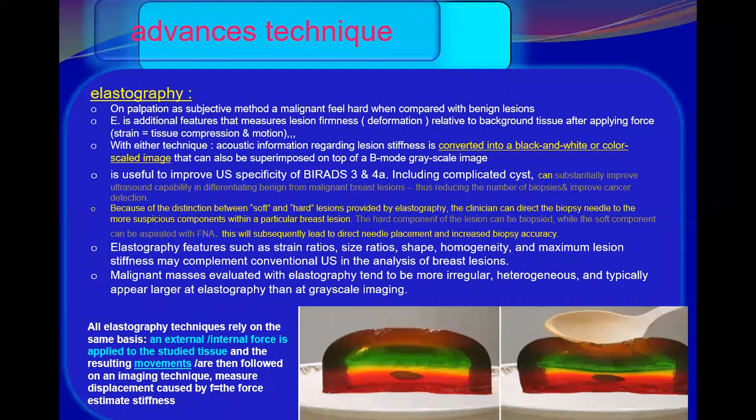What is the role of elastography? Here, how can it help us in the evaluation of breast lesions and when should we use it? Elastography means malignant goes with a stiff lesion. Benign is less stiff, and graded from 1 to 5. How is it helpful?